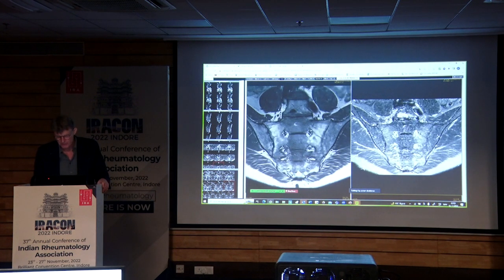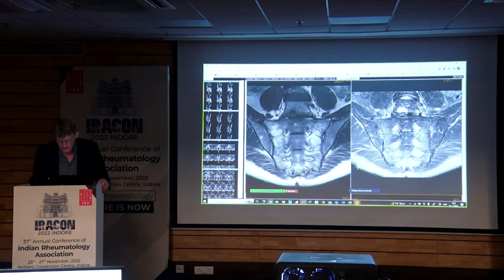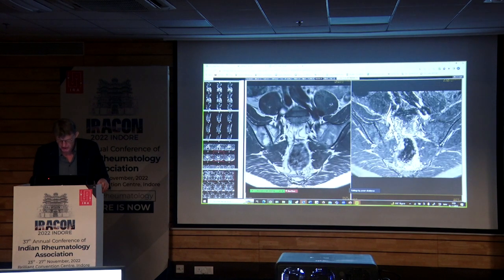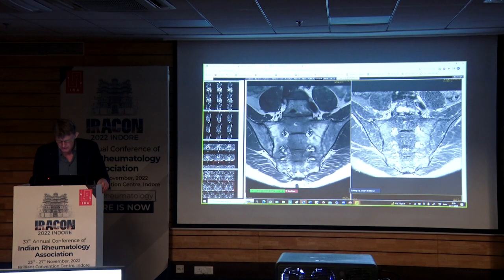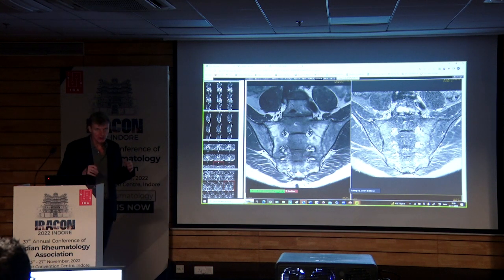Then there is an issue around bone marrow edema here, which is a good question. What is it here actually? The signal is very inhomogeneous. There are some bright areas there, but it's more or less everywhere. And it's also a little bit bright there, so it looks a little bit strange. And down here you see that this fat was meant to be dark, but it's not really. It's too bright, and the tissue you see here is not really brighter than the fat. So I would say that it's a very poor quality STIR image, and that's why I show it to you, because that's real life.